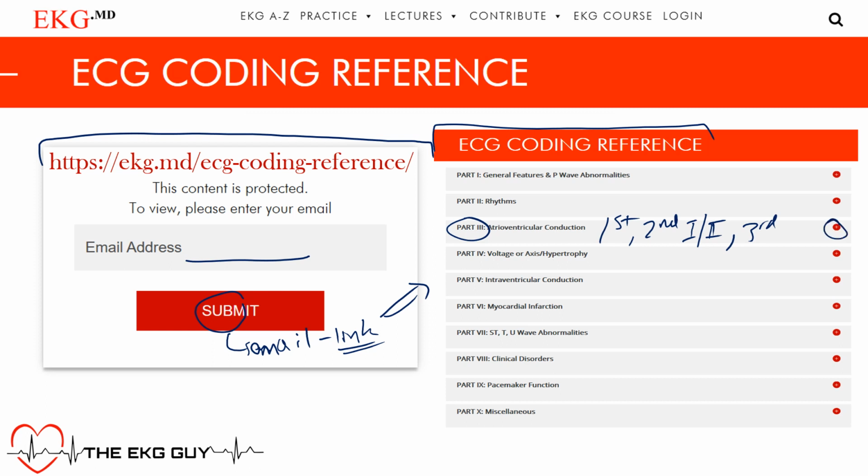So in this lecture we'll look at the different types of AV blocks, we'll look at examples and why they occur, and hopefully get you up to speed with a refresher on all these topics. And you can find some of those examples on the reference guide, and you can always have that to access on the go.